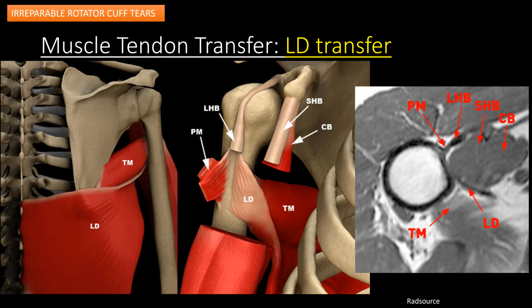So if you want to find the tendon on MR, the easiest way, at least to me, is to scroll down and first find the pec major tendon insertion, lateral to the course of the long head of the biceps. At the same level, you can find the latissimus dorsi tendon by finding the short head of the biceps and coracobrachialis anteriorly and teres major tendon posteriorly, and you see this long low signal, which is the latissimus dorsi tendon.